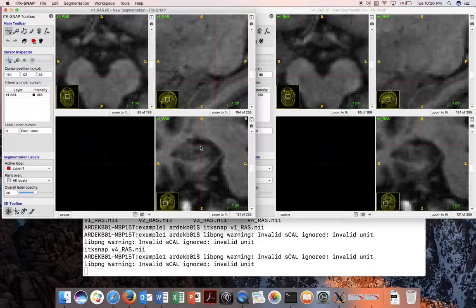So this is what's really exciting about being able to register the images across time, and then either visually, but even more interestingly, using computer algorithms to detect the changes that occur in time and determine whether these changes are a normal part of aging, for example, or there is pathological aging.